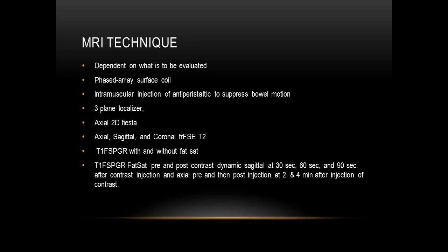For fibroids, uterine cancer, endometrial, cervical, we will image dynamically in the sagittal plane at 30, 60, and 90 seconds after contrast injection. And then we'll do an axial LAVA pre-contrast, and then post-contrast at 2 and 4 minutes after injection of contrast.